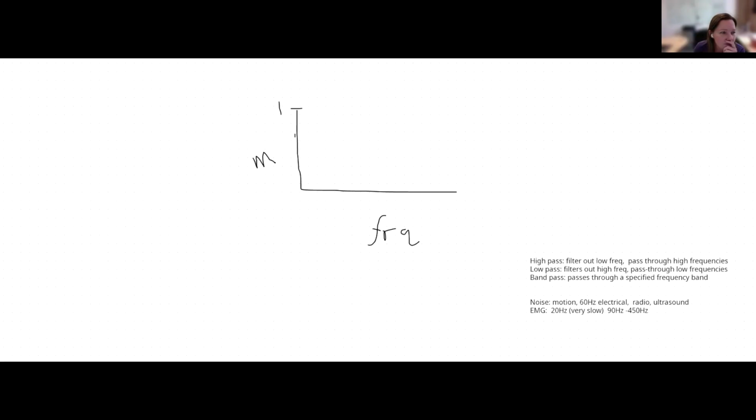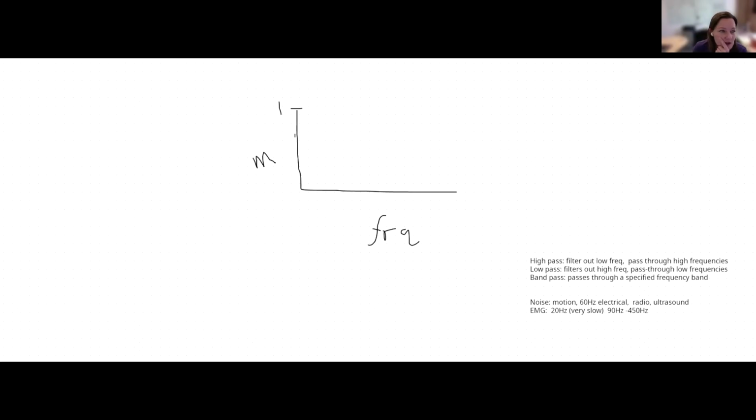What happens if I add a page? Do I get all my tools there? No. Okay. Can you switch to a different tool?